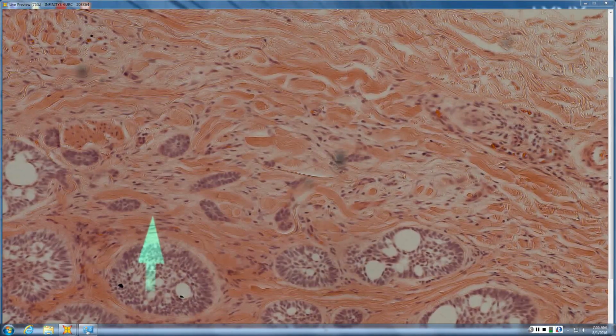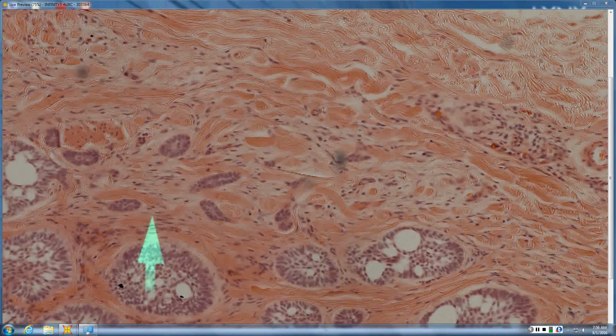Micronodular, and the key is, if it's all within its own stroma, you can define it with a curette. You curette right to the edge of the tumor. In fact, you can curette all the tumor away because of that soft, squishy stroma. Whereas here, in a micronodular where it's between collagen bundles, your curette can't get to them. So they are more aggressive because they are much more extensive than your curette is telling you. Your curette lies, basically, because it's just scraping over collagen, and yet there are all these little tumor islands beyond where your curette is.